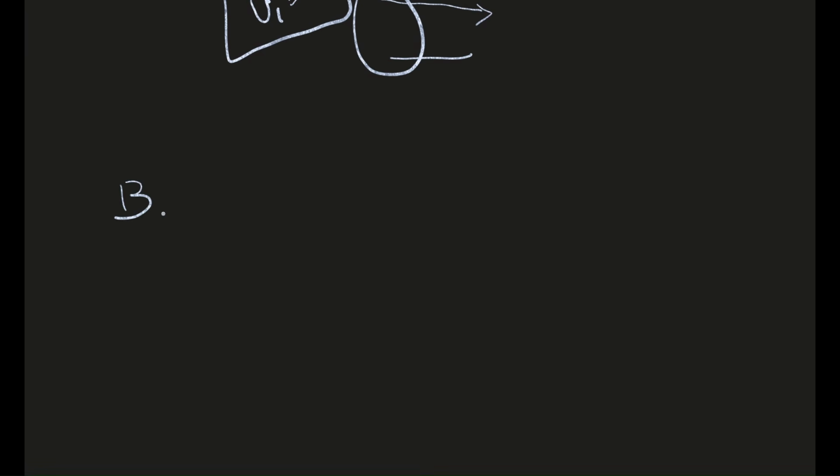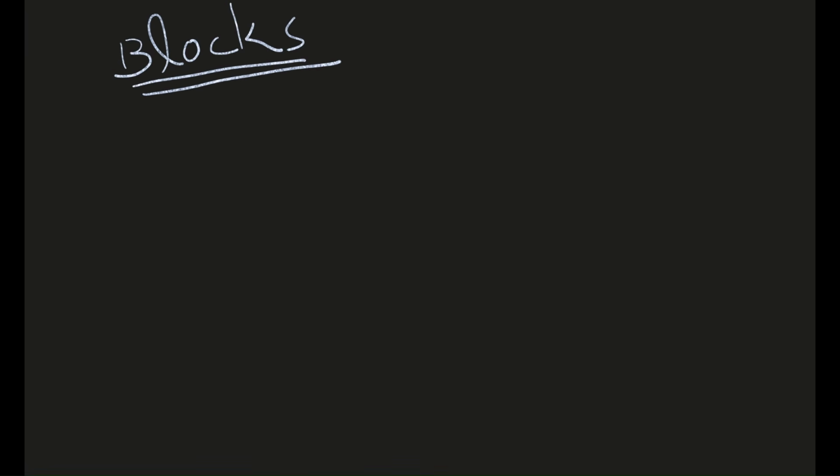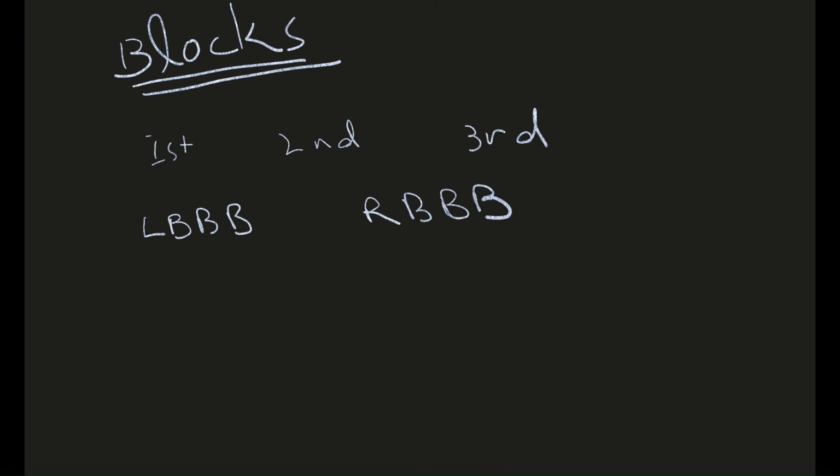Now let's talk about the block. There are many types of blocks like first degree, second, third, then there is LBB, then there is RBB, then there is bi and trifascicular.